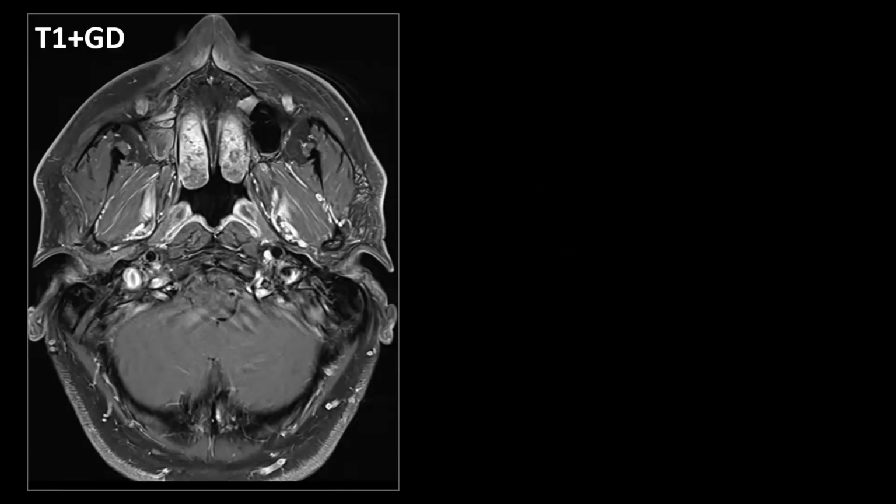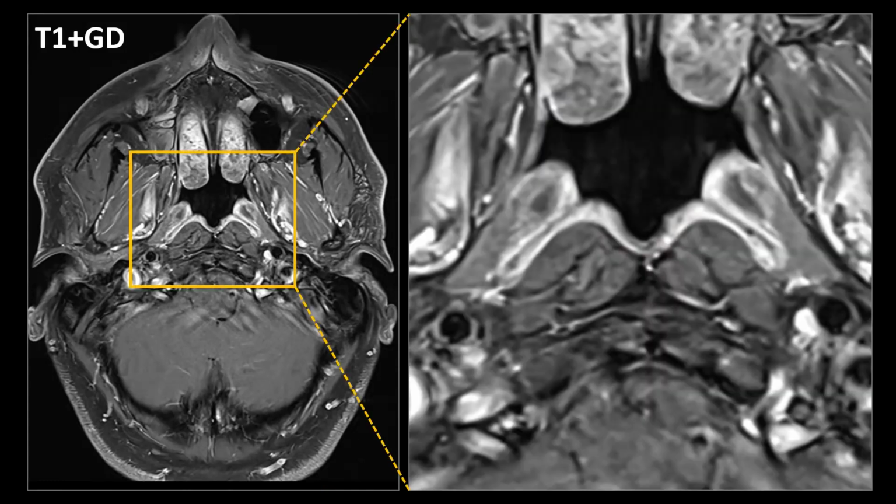Okay, so we have these very conspicuous anatomical landmarks, so to say, which we can always see in a normal nasopharynx on imaging studies. This is a T1 weighted image with gadolinium and fat saturation. And if you magnify it a bit, we clearly see the Torus Tubarius once again laterally, along the lateral nasopharyngeal walls.